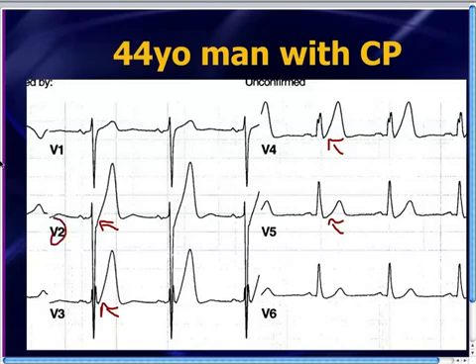And then from that ST segment depression, you've got a T wave that shoots straight up and then down. It's almost like hyperkalemia, but the potassiums are normal. These tall symmetric T waves are highly predictive of that critical occlusion in the proximal LAD. All right, again, ST segment depression, which shoots straight up into a tall symmetric T wave. When you see that, you've got to worry about it.